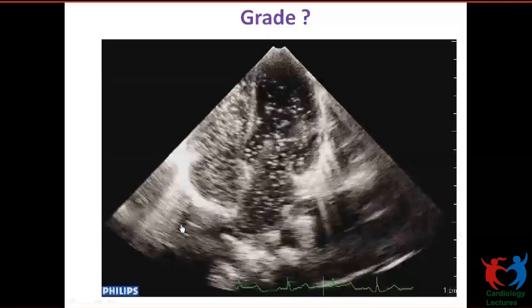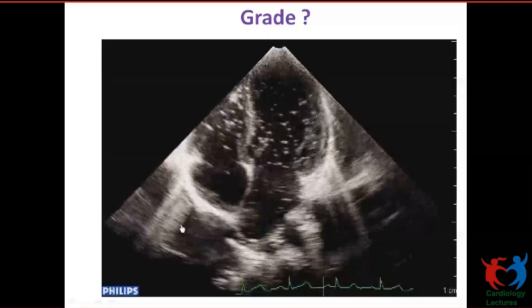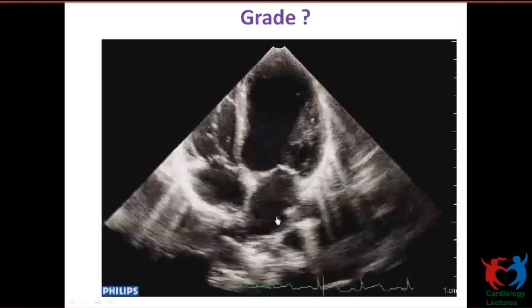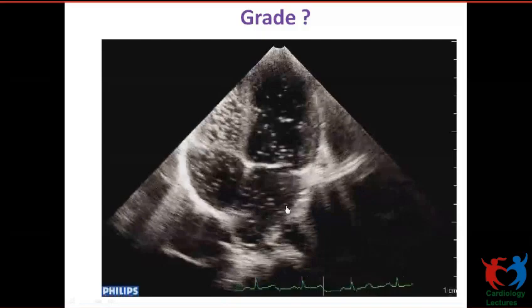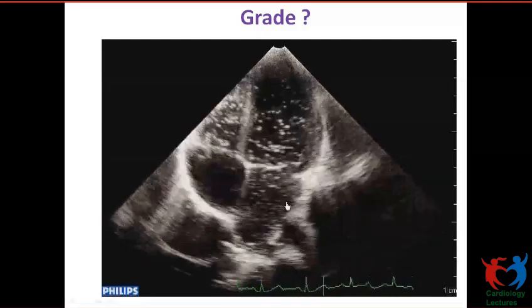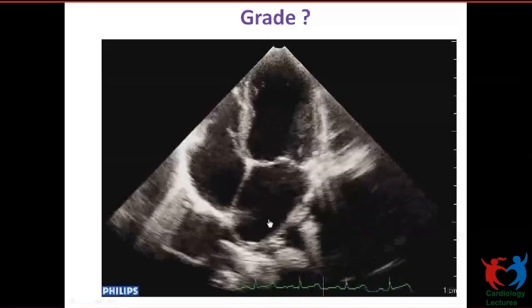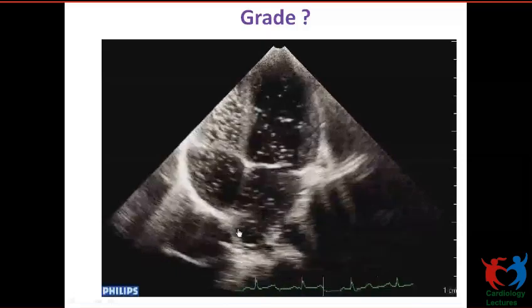Is it grade 2 or 3? It looks like grade 3, right? It's quite intense. So it's difficult to make out from where it is coming.